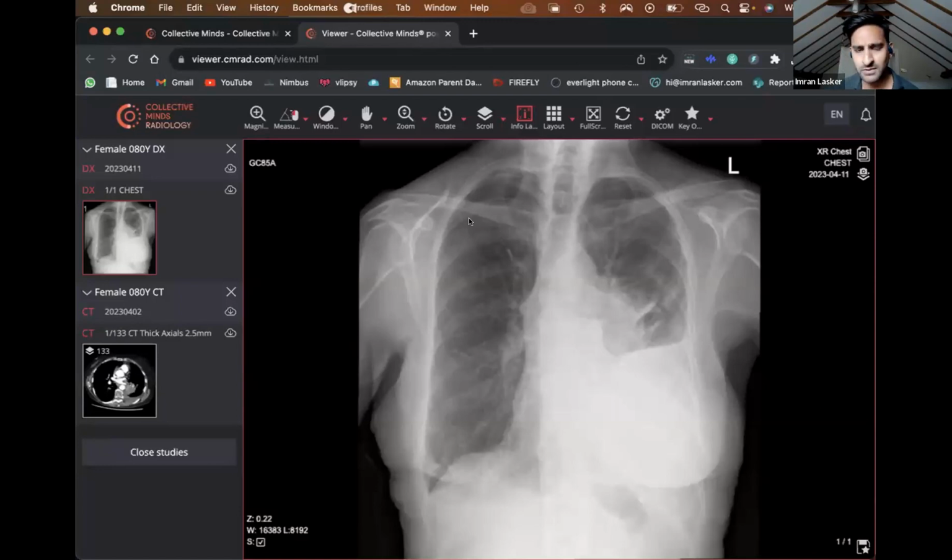Okay, so what we're going to do, I've got my pen out now, and we're going to have a look at this adult patient, and they've come in with a bit of shortness of breath, right? And so we do have a poll, so most of you will hopefully get this straight away. But have a look, and Danish, if you can just put that poll out and tell them, I'm going to leave it up for people to give their answers, see whatever they think, while I go and talk through this actual image in the background.